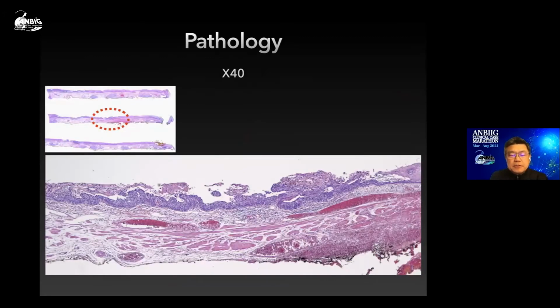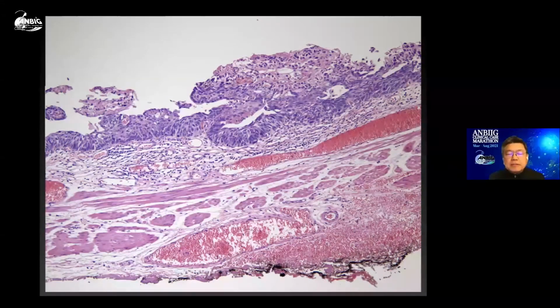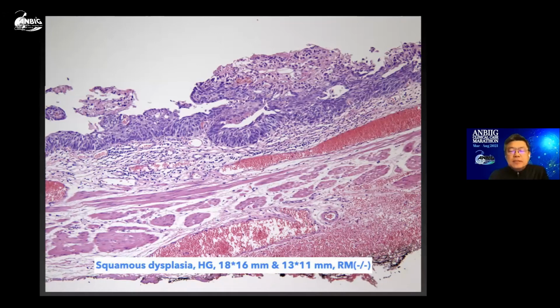This focus and this focus, you cannot find invasion of the basement membrane. So this is high-grade dysplasia. This is the end of the first case.